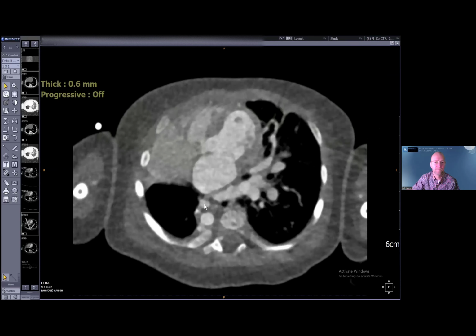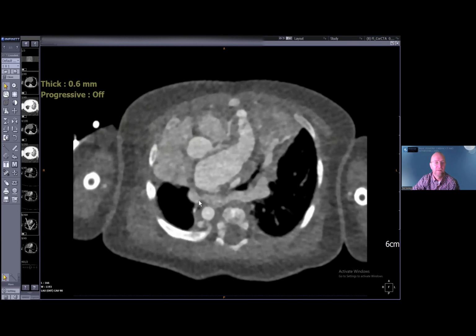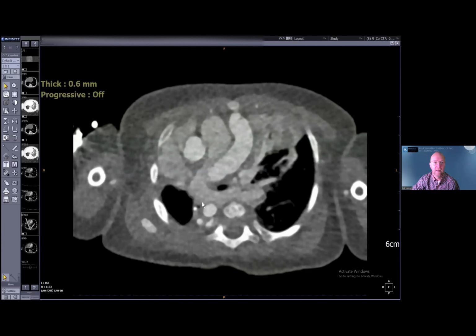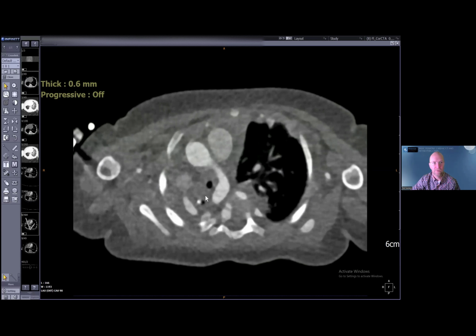Yeah, I think you're right. Very cool. That's why I'm thinking this is hypoplasia of the right lung. This is one of the cases that is really interesting. Let's talk a little bit about it. Yeah, it's very, very interesting.